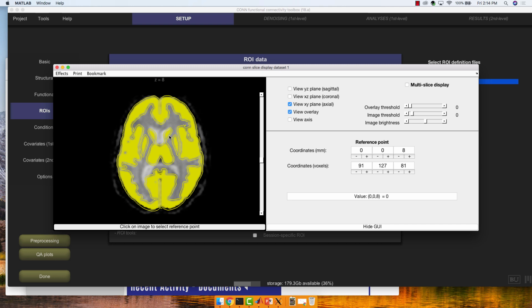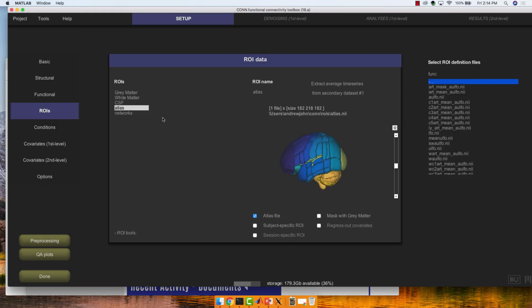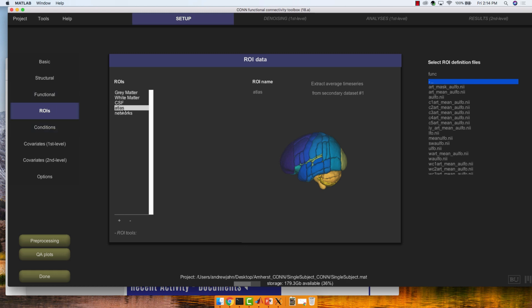Sorry to back up a little bit. How do you get into that? Oh, you already done? Yes. Oh my goodness. Yeah, you go to ROIs and then click on Atlas and then click on this.